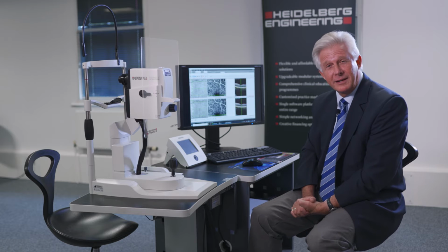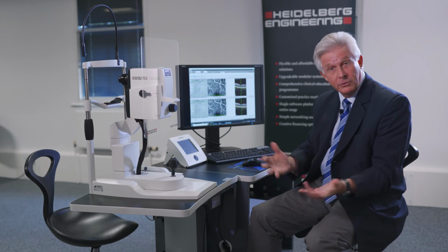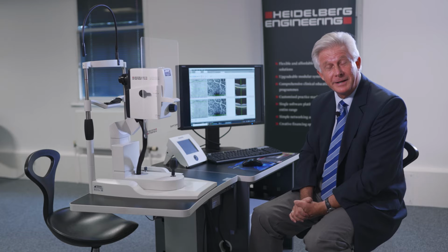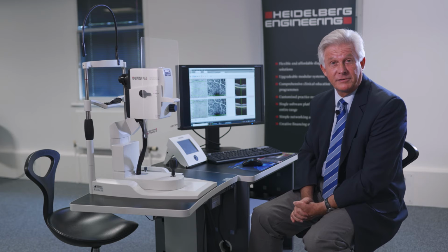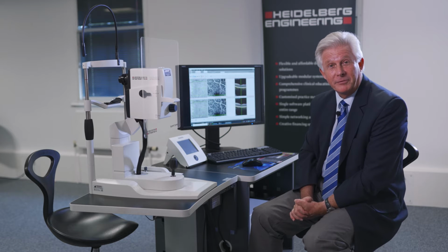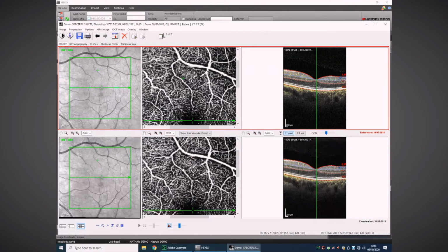So it's quite challenging. And you do need these special components we call Spectralis DNA, if you like: TrueTrack, live eye tracking, and the art of OCT, sufficient sampling or averaging of that flow signal going through that capillary. And you need the resolution to be able to look at that capillary properly to make your assessment.